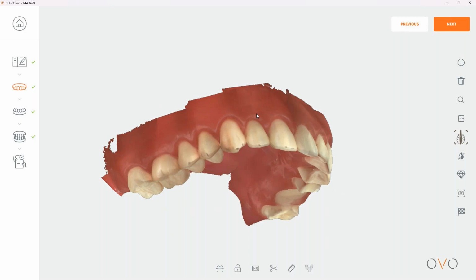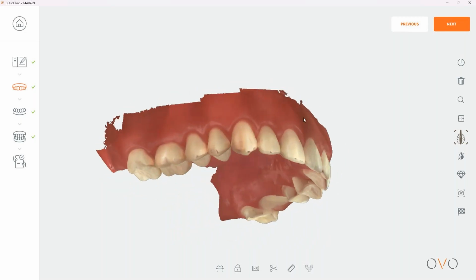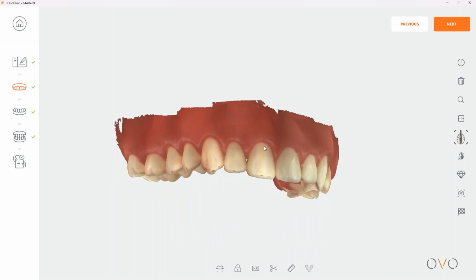Patients will recognize their teeth in color. So this is our PLY file. Now, again, patients look in the mirror, they see when they smile, they see their centrals, they see their anterior teeth. Really good option for working with the patient.